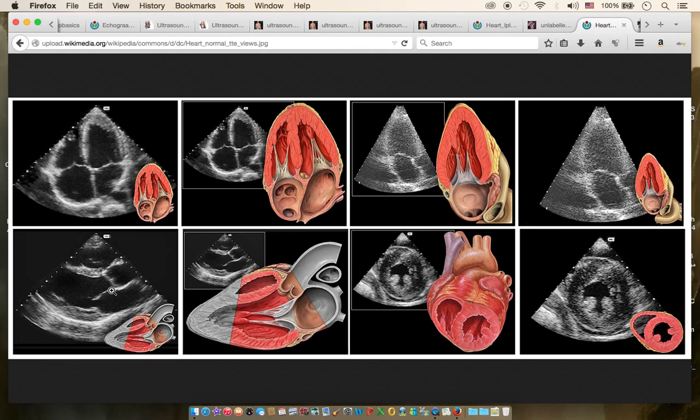Now this is the anterior leaflet of the mitral valve. If you see that in the video, after a minute I will show you the video. The anterior leaflet of the mitral valve is finger-like, and it is coapting with the posterior leaflet of the mitral valve. This is normal.